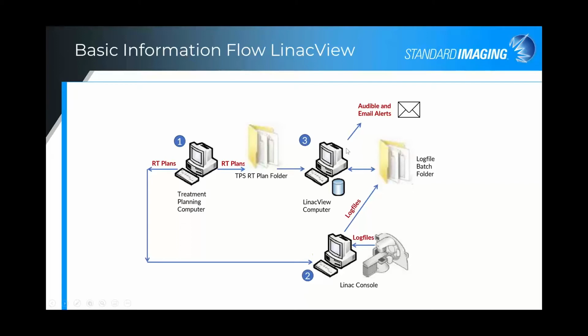And once LinacView has the RT plan in the system, then the log files that are generated when the RT plan is delivered automatically synchronize with the RT plan, and the analysis as is configured in the software either provides a pass, which is visible in the software, or alternatively, if there is an alert or a failure of the delivered plan, then an audible alert will occur on the computer if you have it configured that way, as well as emails being sent.